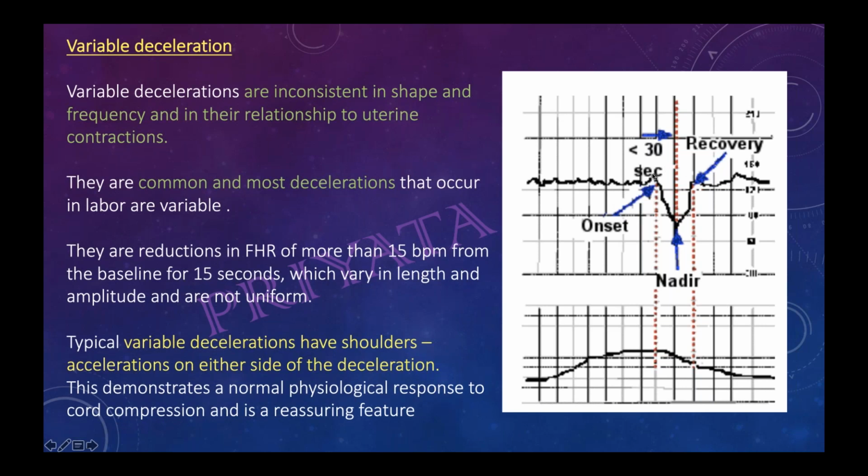Okay, so a small rise in the fetal baseline rate before starting the contraction and after ending the contraction. These are the shoulders. So if they are present, we are happy about it. So these are the shoulders that you have to know.